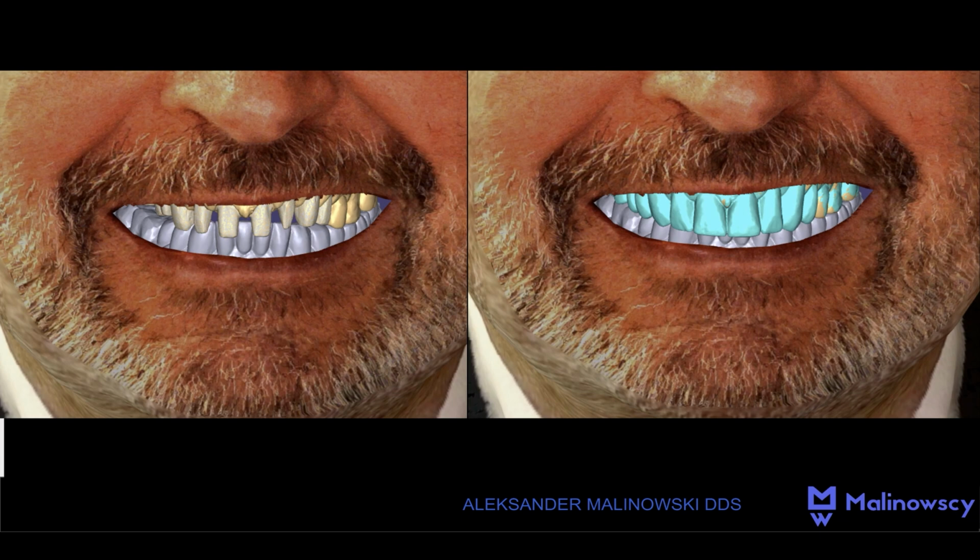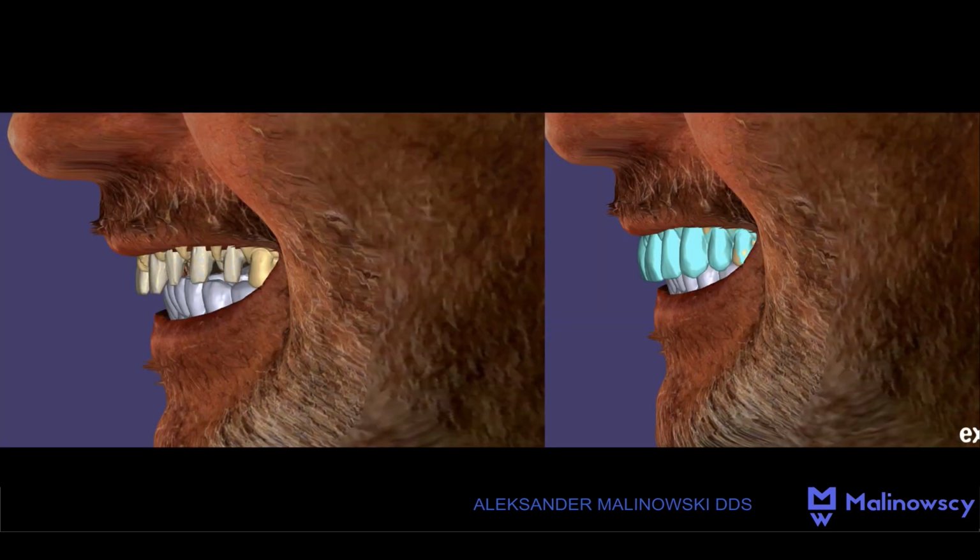You can see the facial scans illustrating the design plan alongside the teeth that have been prepared by grinding. Here we can see the same scan viewed from the side. Please notice how the teeth protrusion was limited despite the relatively conservative preparation.